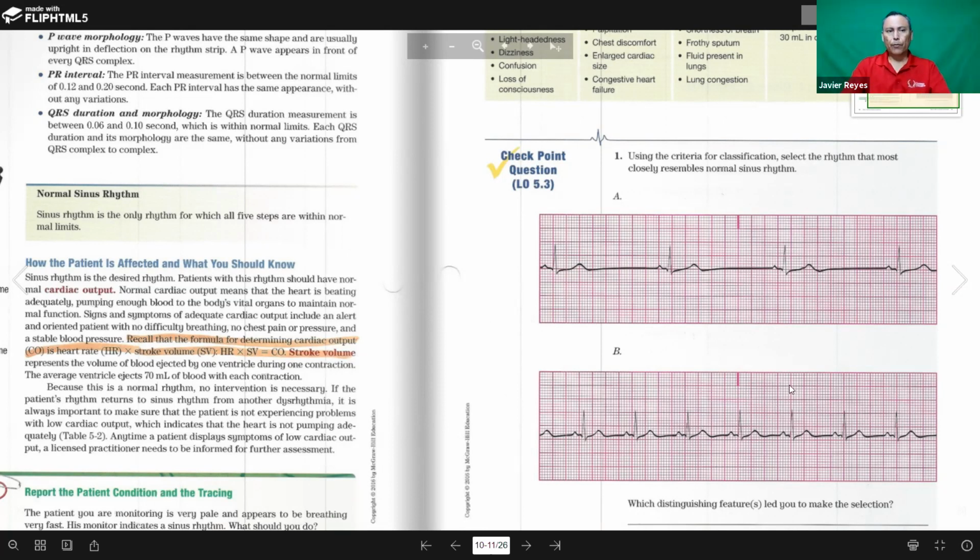All right. So I got 75 with the 300 method. See, it's not very accurate. Okay, 75 to 78, still pretty close. But at least you know now how to calculate the rate. So is the rate within normal? What are the normal parameters for a heart rate for adults? 60 to 100, correct? So 78 is right in the middle.